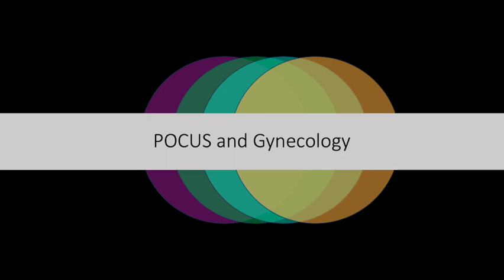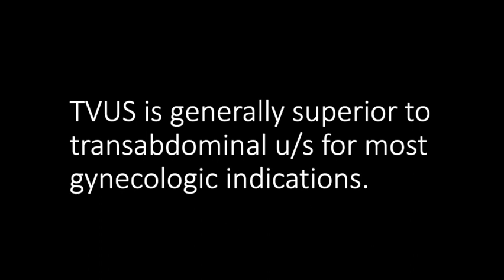This lesson will end our series on POCUS for women's health, and will focus on non-obstetrical findings present in patients with traditionally female reproductive organs. As has been true for most other exams in this module, transvaginal ultrasound is generally superior to transabdominal ultrasound for most gynecologic indications. So, if you plan to routinely use this technology for gynecology exams, I again encourage you to devote some time to practicing this skill.